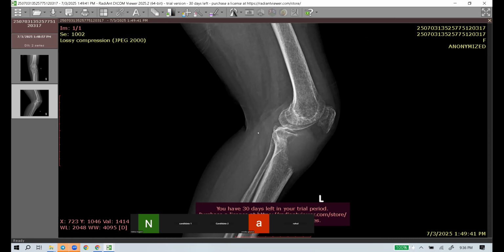So you're mentioning proximal tibia. Would you say any better characteristic location and thereby characterize? GCT. Okay. So you were saying in the AP image that it's narrow zone of transition. Now, what do you think? No, sir. It is not a narrow zone, sir. Actually, it's a wide zone of transition. Okay, done. We'll go to the last case.